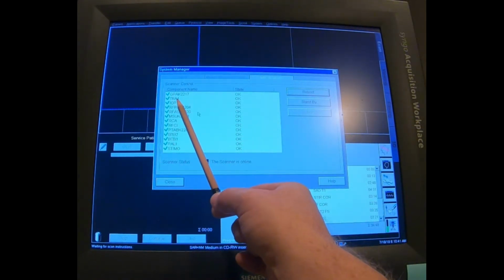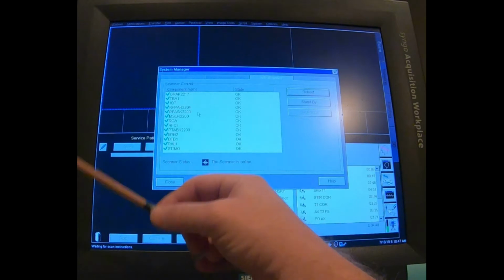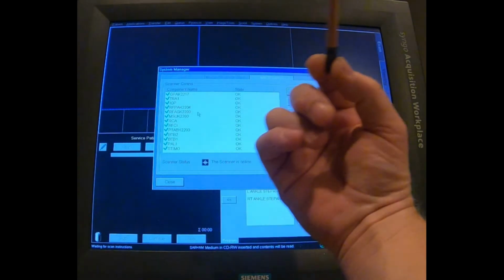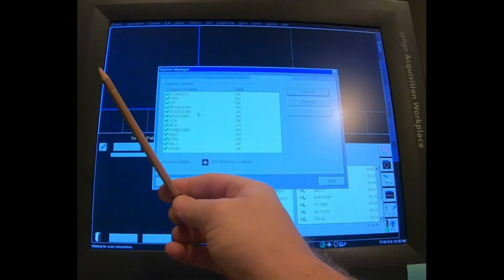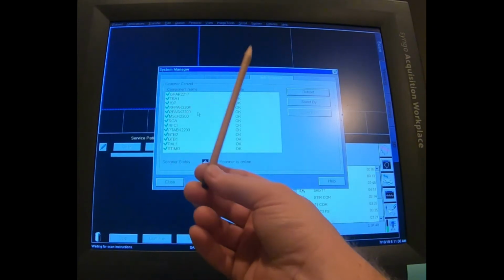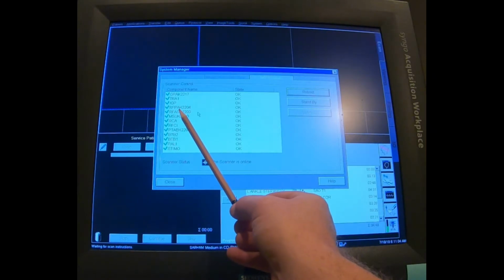The TRA1 is the transmitter. The IOP is the input-output processor board. That changes all of the electrical CAN to fiber optic CAN. Fiber optics are everything inside of the magnet room. That way we can talk to it without actually being an electrical signal. It's cleaner, it's faster. RFPA is radio frequency power amplifier, K2204.